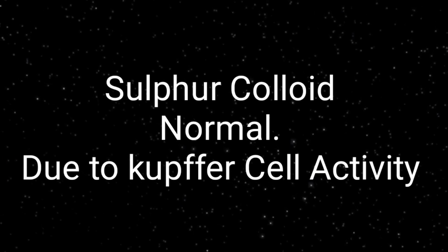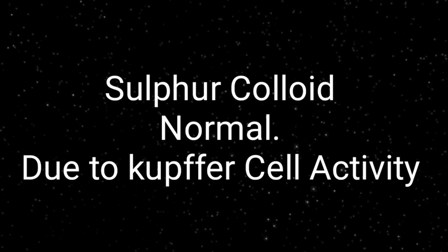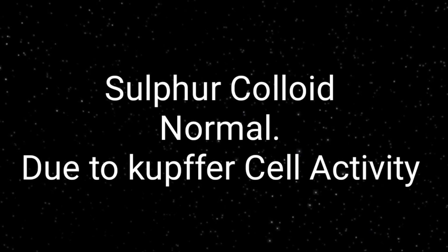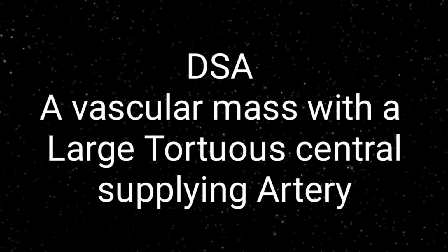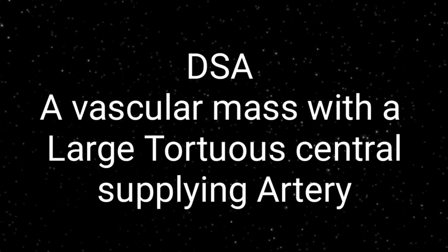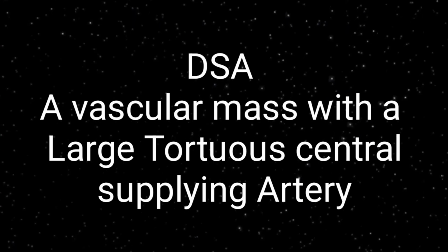When you do ultrasound and CT scan, after that comes scintigraphy, and on scintigraphy this lesion will appear normal. On DSA imaging, as it is a vascular mass, you will see a large tortuous central supplying artery, and that is a characteristic of focal nodular hyperplasia.